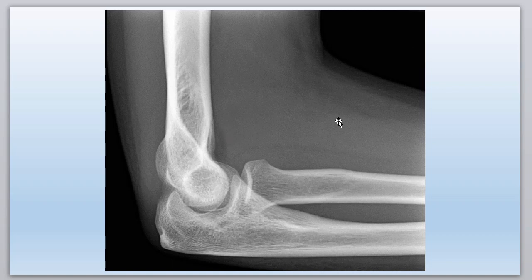Now there's two important things that you look for with fracture. If someone came in and hyperextended their elbow or they fell off their skateboard, you've got to look right here and right here. Because when the articular cartilage is damaged and bleeds inside, remember that articular cartilage we saw kind of making the joint airtight? When it bleeds, if there's something fractured inside the articular surface, you can get this sign right here.